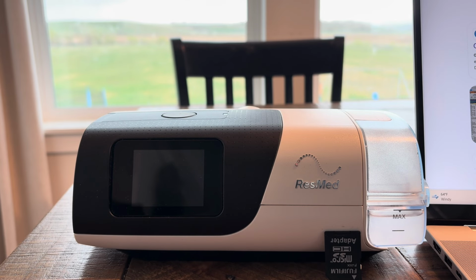This is what the data doctors will see when they get your data, even though they get it through cell networks. We'll go over the equipment needed to obtain the data, the MyAir app and why I think it's garbage data, how insurance rates usage, why doctors don't help much, and how to use the basics of Oscar to try to help you.